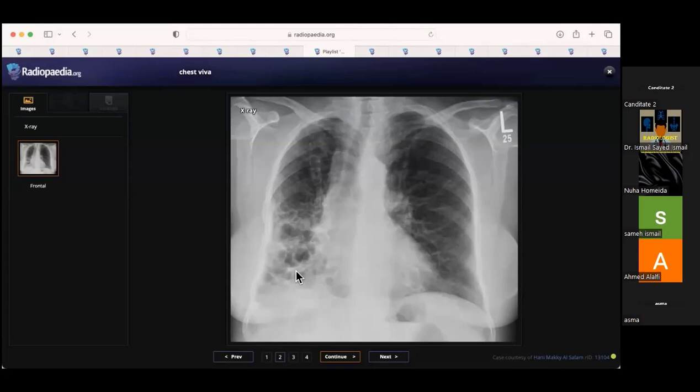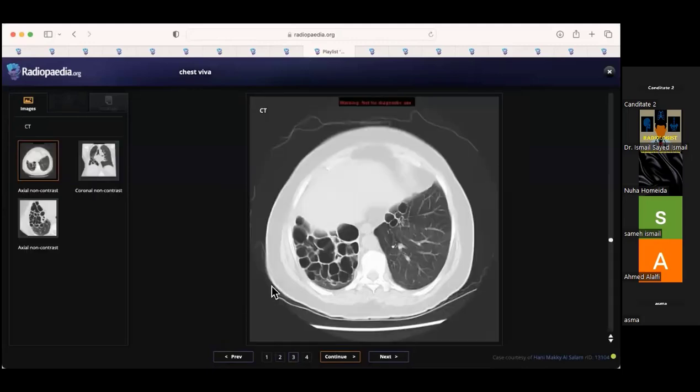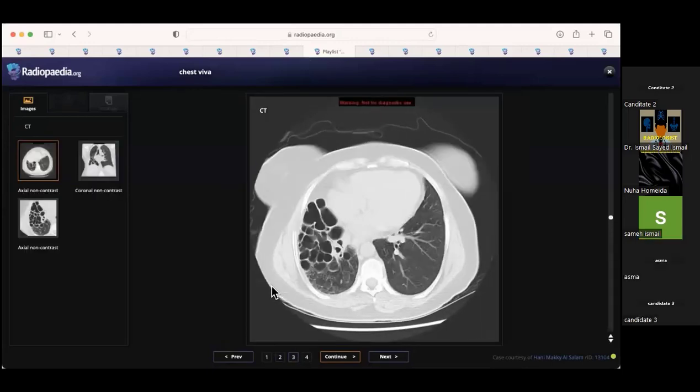Yeah. So, what do they look like? So you're right. You're going down the right route. So it is bronchiectasis. Can you tell what type of bronchiectasis? They look cylindrical and circular in appearance. Yeah, so cystic. The word is cystic. I'm not sure which type on the radiograph. I can put them as maybe cystic bronchiectatic changes.